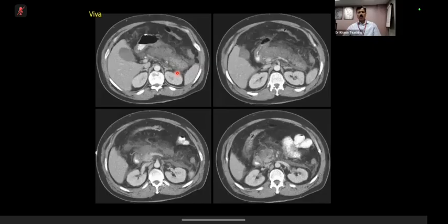Okay, well done. So when you see a case of acute pancreatitis, you must comment on two things. One of the things is visible on this case. Are there any non-enhancing parts of pancreas? Because that means that there is necrosis going on. I'm not going into staging, etc., because various centers use their own staging.